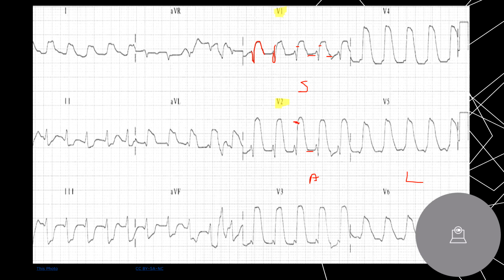So you are looking at a true widowmaker. Like this is a left main coronary artery infarction. It's down, up, so huge left axis deviation. Yeah, this is a huge infarction. But anyways, you have it lateral, septal, anterior, inferior is reciprocal. Yeah, this is a high up.